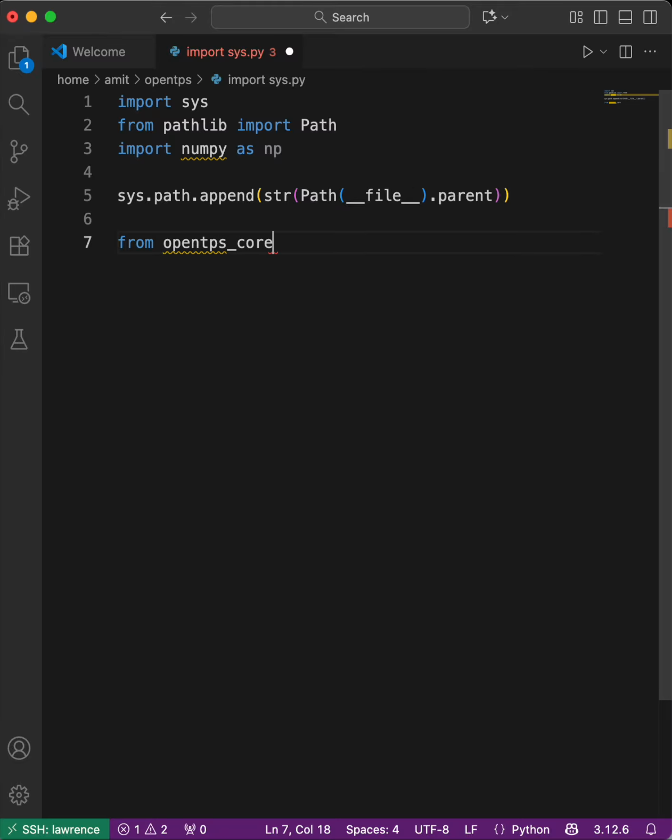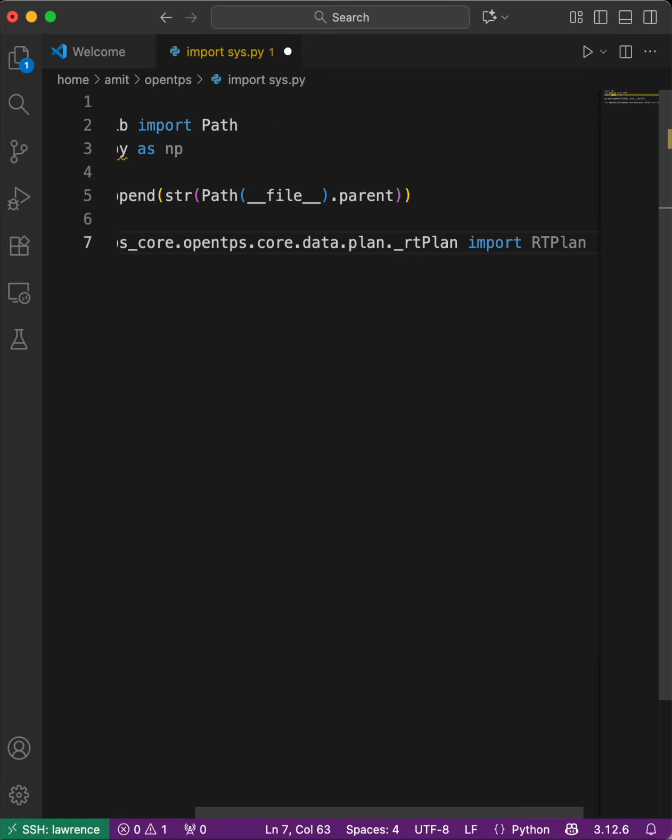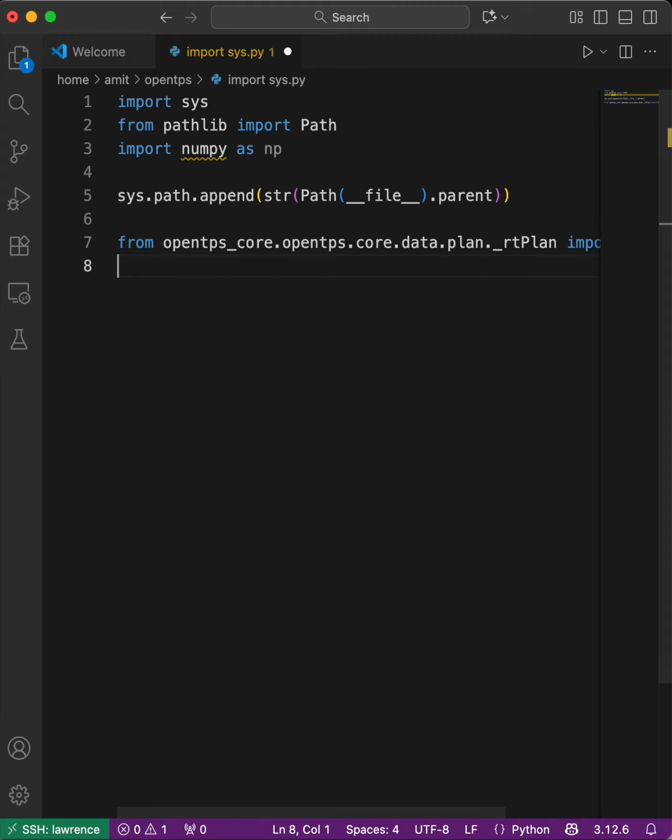Yeah. So because the file has to be in the same folder where the OpenTPS processing and the MCsquare source code is present. So now it's coming on its own. Now all I have to do is enter, and it will be fast. I hope so. Import plan, yeah. That is how I will put the cube, the water phantom.